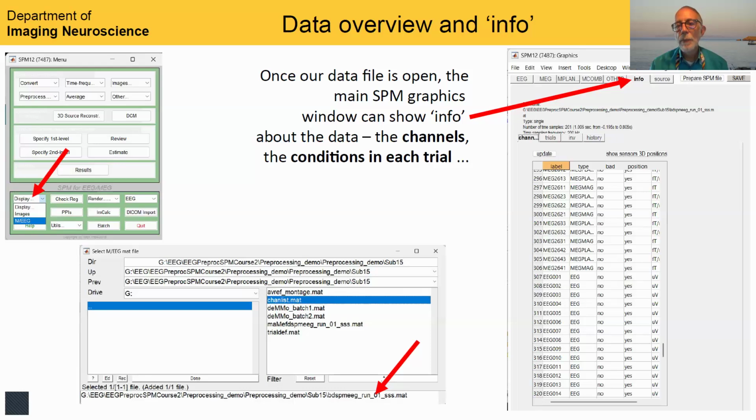This is going to bring up a file selection menu. And again, you're going to click on a file to select it. It is going to then move from the right panel to the bottom line, as I have already done there.